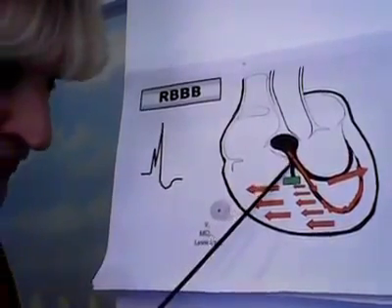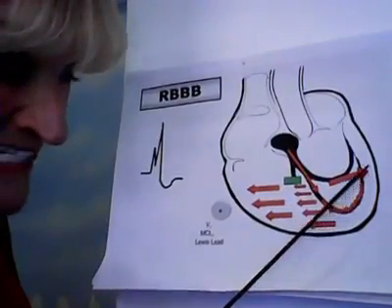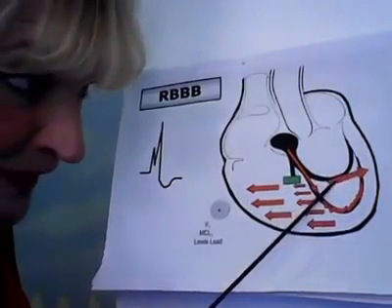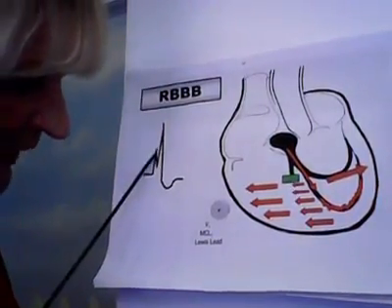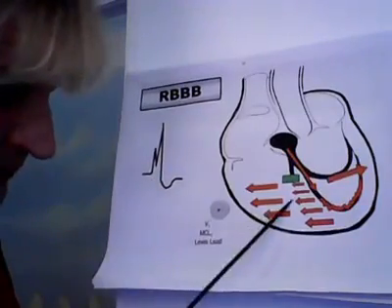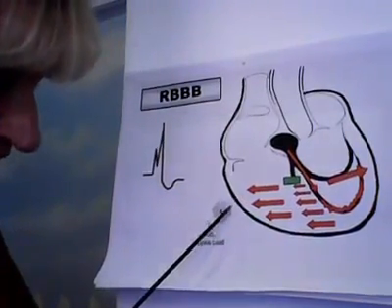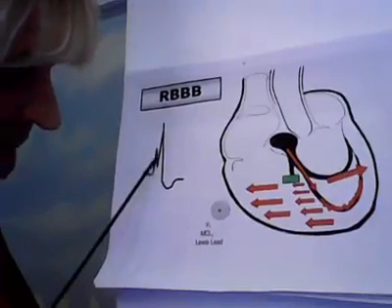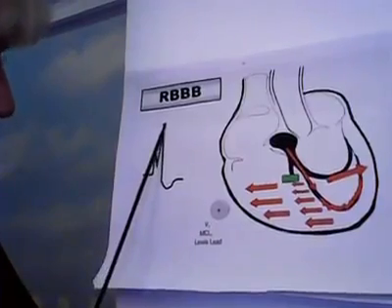The other impulses are going down the left bundle through the Purkinje fibers and then begin to depolarize the left ventricle in this direction away from the positive sticky, and that's why it goes down. Then when all these go across the right ventricle and the right ventricle contracts, since I'm going towards the positive sticky, it goes up. So what you have here is a little r followed by a big R.